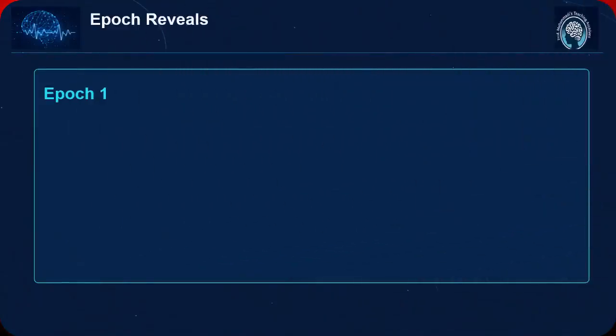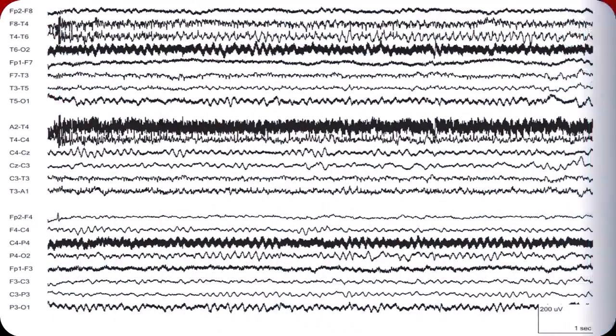In this example, the pattern shows very high-frequency artifact that obscures the EEG background in several channels. A key feature is that the artifact does not form a normal contiguous cerebral field. Instead, it appears in a way that is more consistent with local electrode impedance issues and environmental electrical interference. This is an important teaching example because continuous high-frequency activity can be mistaken for other sources of fast activity. But its distribution and persistence should direct attention toward ambient electrical artifact.